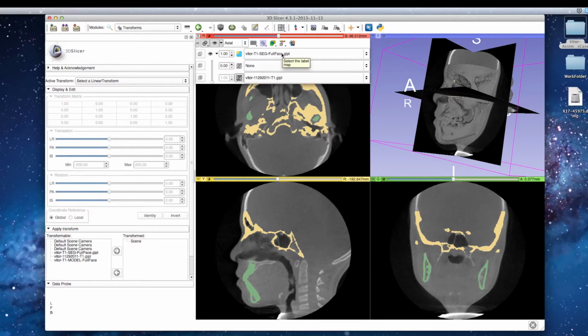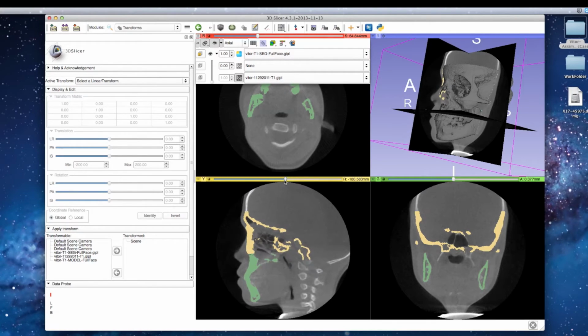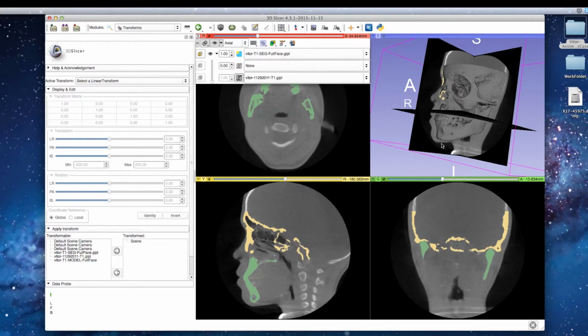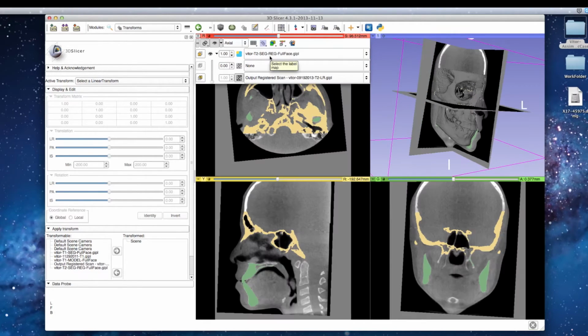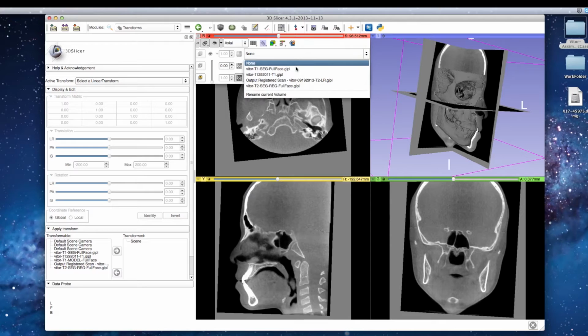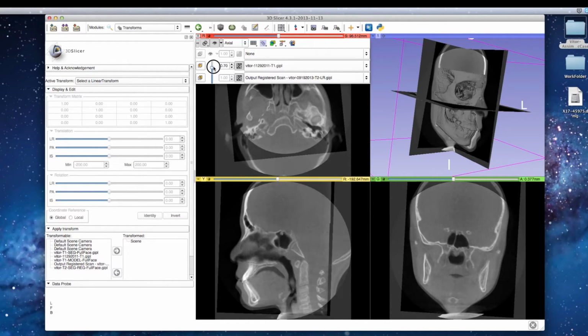The segmentation file can be selected at the first expandable bar. It's possible to compare the superimposition of the scans by selecting each one in the last two drop-down menus in one of the windows, the red, yellow, or green. Next, you can move the crossfade bar to change the transparency in between the scans.